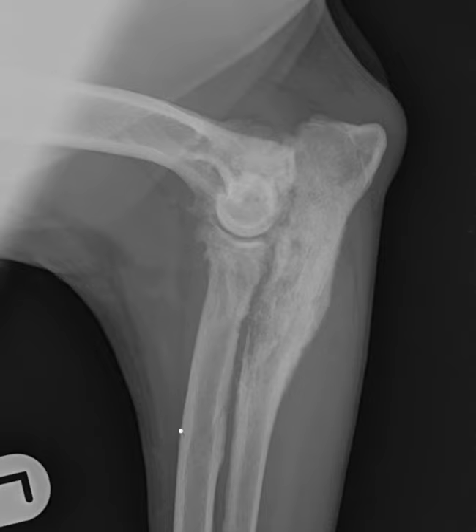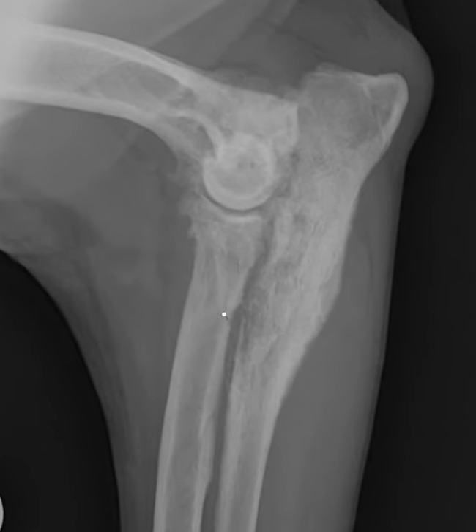As you trace the cortex of the radius and ulna, I'm hoping that you noticed that the cortex becomes very indistinct here in the region of the proximal ulna, both on the cranial and also on the caudal aspect. Additionally, I see areas of radiolucency where instead of the normal trabecular pattern, like I see here in the mid-radius, we see disruption of the normal trabecular pattern and mixed lucent areas along with areas that have increased mineral opacity. These are findings of bone lysis.